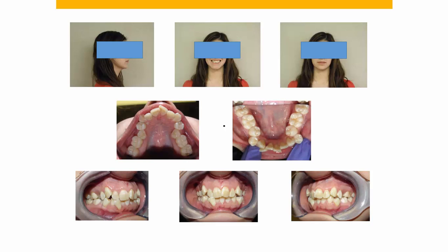In this particular case, let's say, for example, you knew that the lower right second bicuspid had significant decay and would need a root canal and a buildup and a crown lengthening procedure. Would you consider extracting the lower right second bicuspid versus the lower first bicuspid if you had that information? Well, I think the answer is yes for most of us.